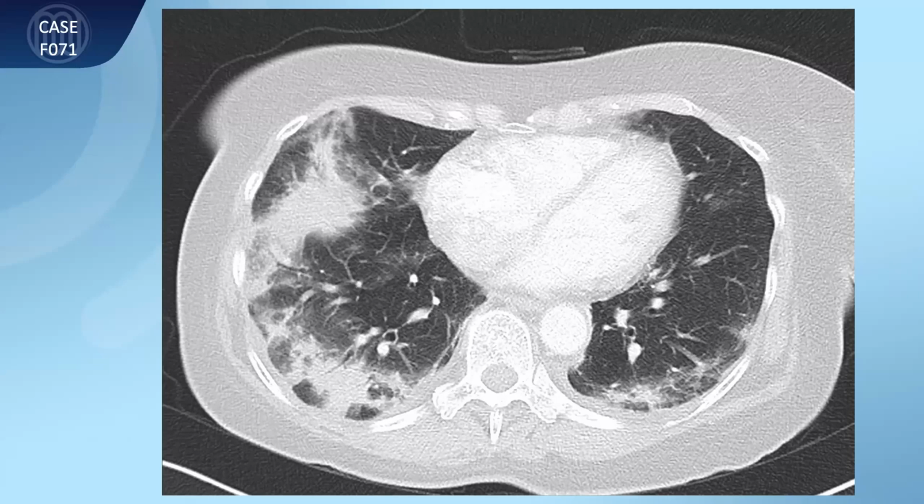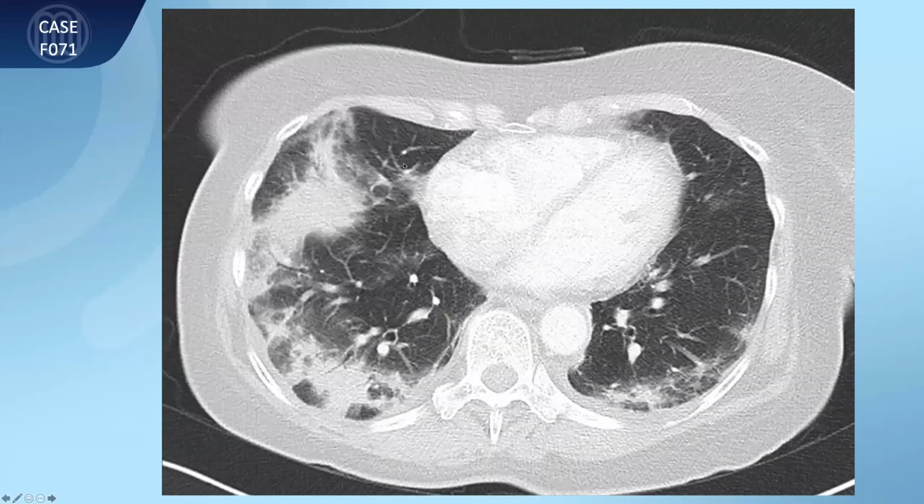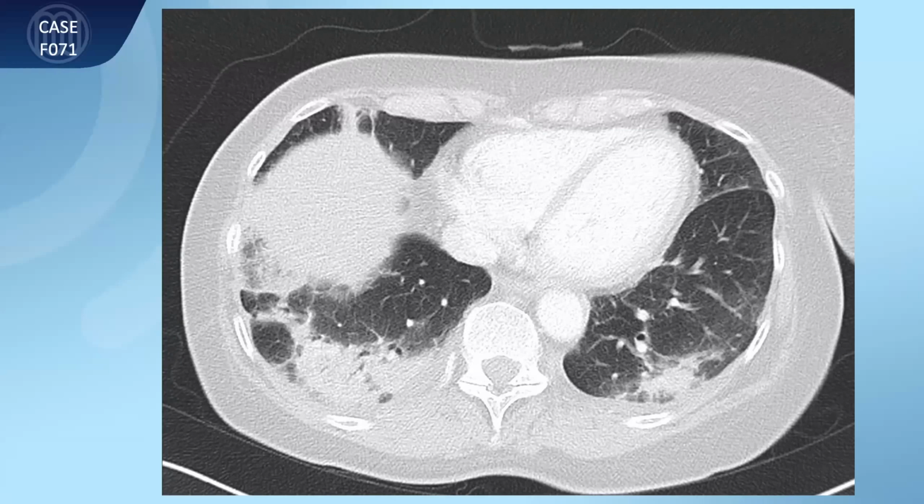What I see here are consolidations. There's an increase in density. I don't see any vessels, so that's consolidation. And this is seen here in the context also with some reticulation, but not that much. And again, like with all the other fibrosing lung diseases, we look at the distribution, and you see here a clear basal and peripheral distribution of these findings. And this is what fulfills the criteria of organizing pneumonia.